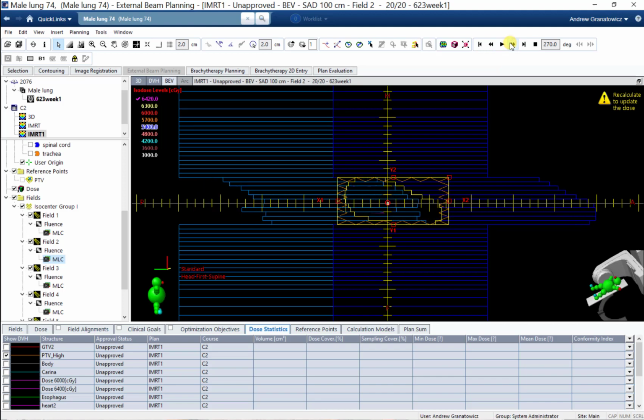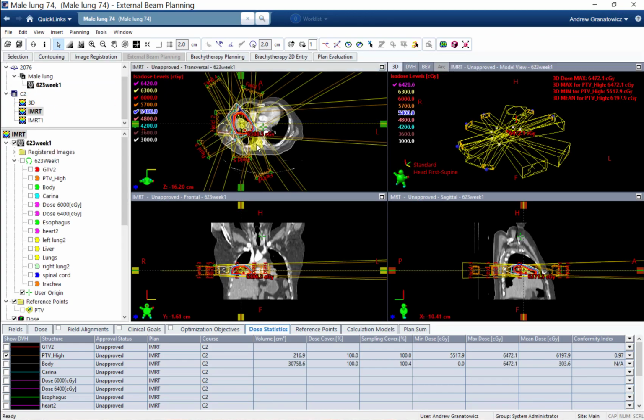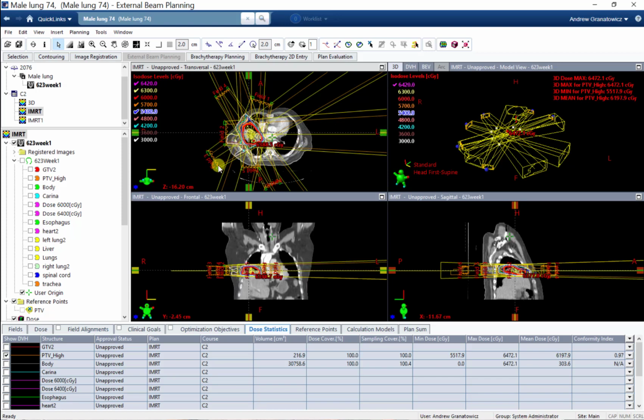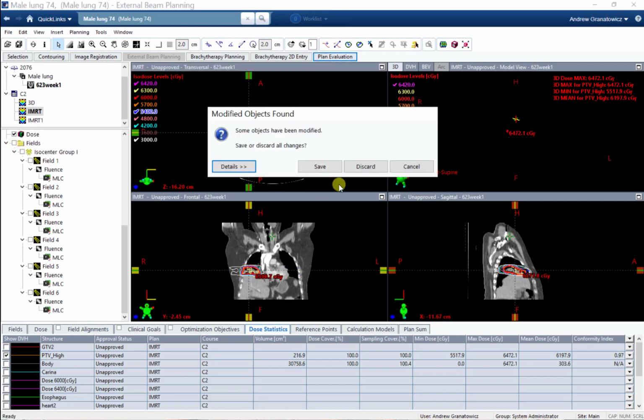So if you think about it, theoretically, you could get the same plan that we have here with IMRT, you could get the same plan with 3D. It would just take forever. Practically, it's not possible. It's just unreasonable. It would take too long to figure out how to replicate those patterns, those field-in-fields for all these beams, right? So IMRT is definitely going to look a little bit better, right? But let's just take a little bit deeper dive.